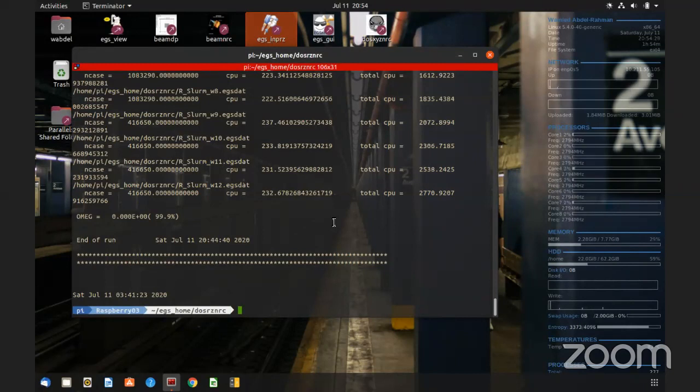For Beam NRC for different. Okay. Beam, the phase space files are actually in the main directory. Okay. So you see that because you're doing phase space files. Yes. Okay. The phase space files, you're going to find them in the main directory. That you shouldn't be worried about. Okay. So I just have to change the option just to restart.